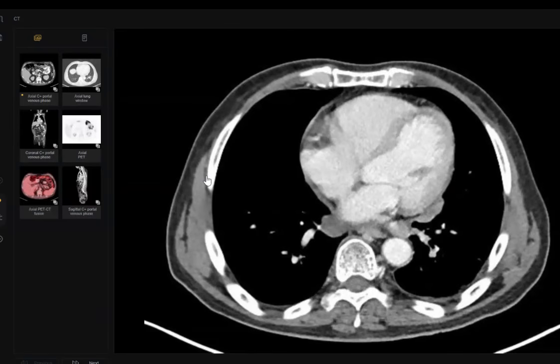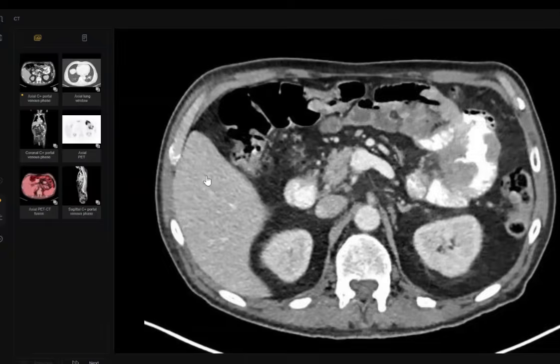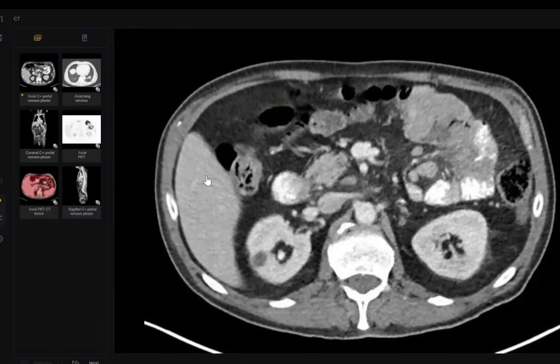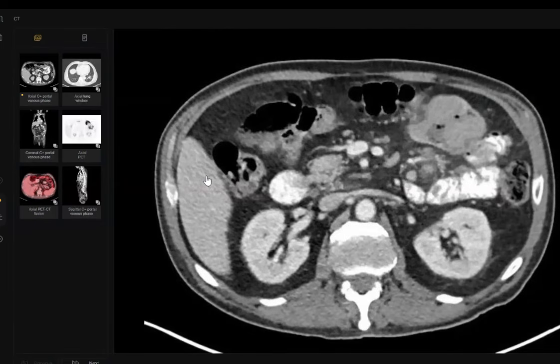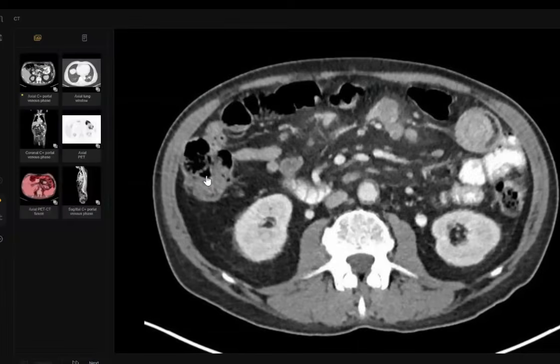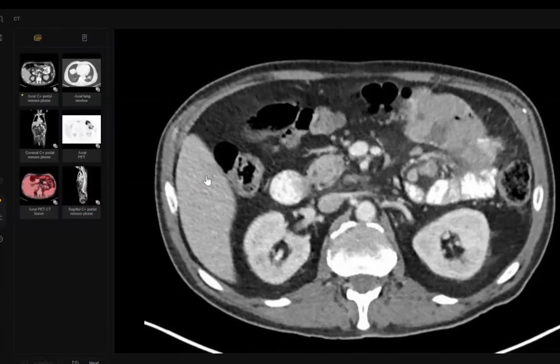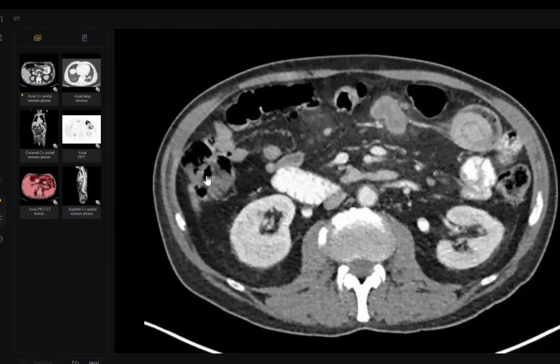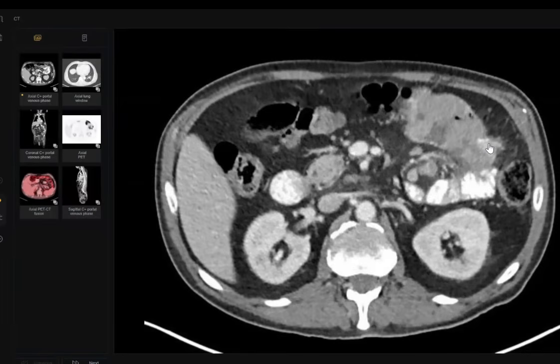Excellent. Sir, what do you think of this lesion? What else other than lymphoma and adenocarcinoma in the bowel? This could be metastasis. It could be melanoma because there was some puckering in the skin and there were a few surgical staples. There is a mesenteric bilobed mass and an intussusception of the bowel loop, likely due to the mass acting as a lead point.